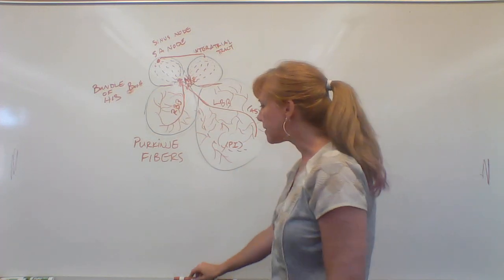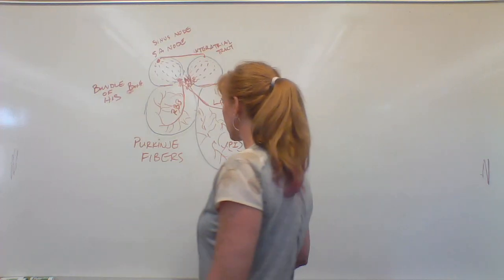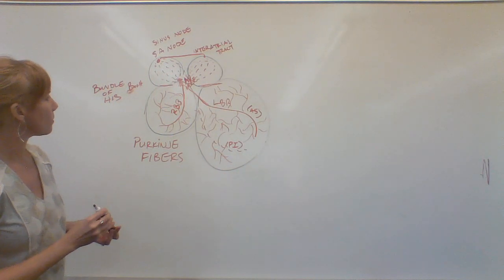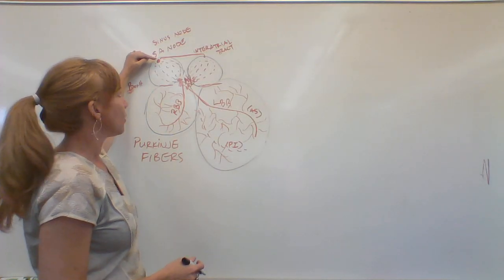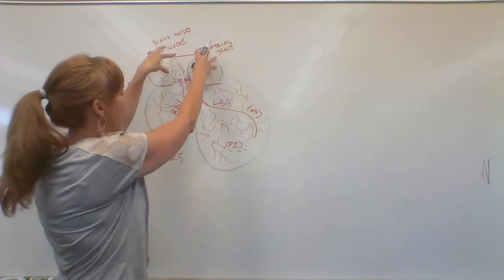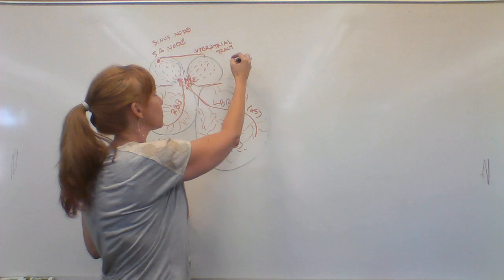All right, so how does this relate to waves that are occurring on the EKG? Let's figure it out. When the sinus node comes up with electricity, shoots it over here, and the atria depolarize, during this time, it creates what we call a P wave.